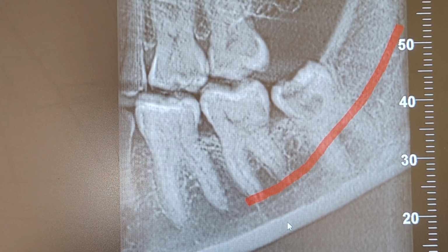And in this particular case, there were no other radiologic signs like darkening of root, narrowing of canal, etc. This is an ideal case which is indicated for cone beam CT because panoramic radiograph usually doesn't provide details on the buccolingual position of inferior alveolar canal, which definitely can be seen with the help of cone beam CT.